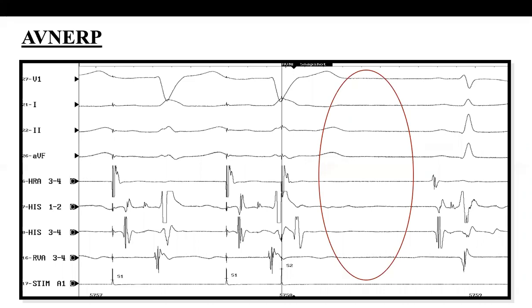So we have the opportunity to see this spike. Where is it exactly in the heart? Is it in the atrium or the ventricle? If we don't have the intracardiac recording, we will not be able to know exactly where this spike is coming from. Is it atrial or ventricular? Is it a CS or whatever? But we have the opportunity to have the intracardiac electrogram to see exactly what we are dealing with.